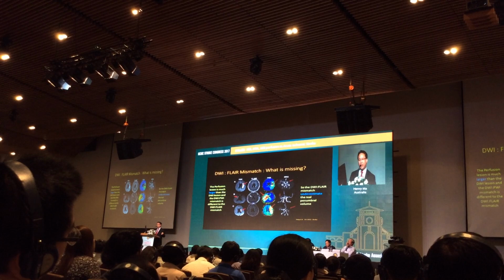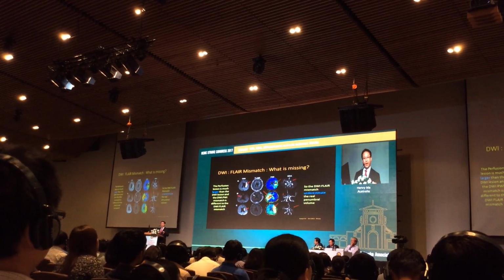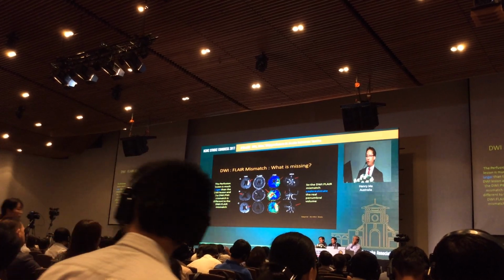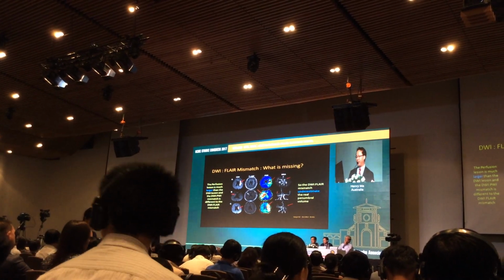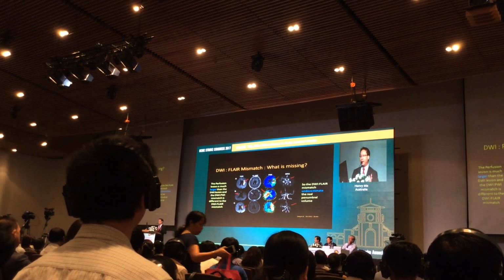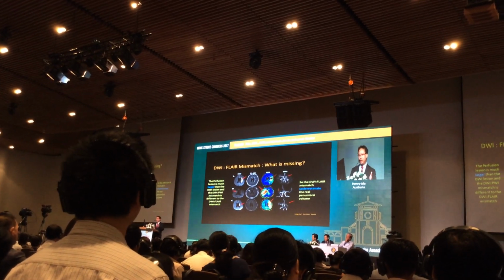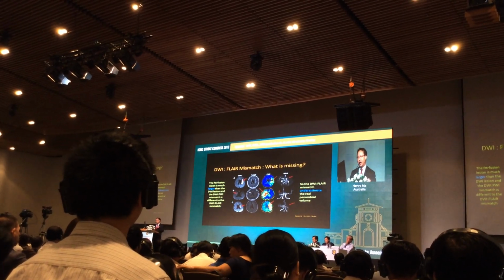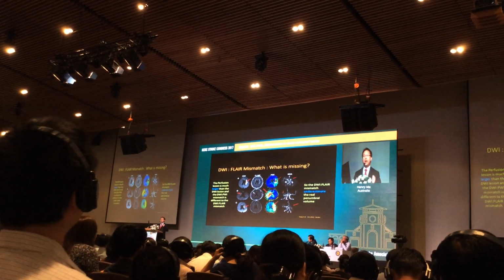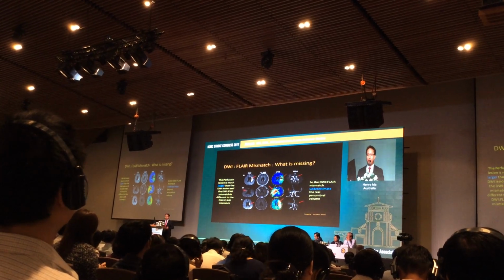If you look at patient B, there is a matched DWI and FLAIR. Again, you say, well, nothing to do, we go home. If we do a perfusion, there's a massive perfusion deficit there with an M2. And similarly to C, another patient, DWI FLAIR matched, but another large perfusion mismatch. So what DWI FLAIR is missing, you're actually missing a massive penumbra when you don't do perfusion.